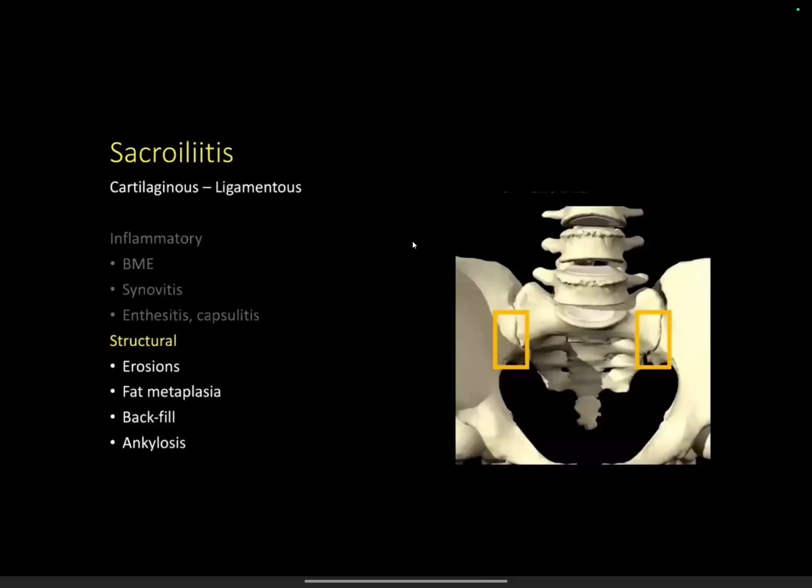In our practice, and there are a lot of papers also which suggest, you see the sclerosis on the sacral side as well, along with edema on the sacral side as well. So edema is not something which rules out osteitis condensans ilii. You need to see the typical sclerosis along with edema. Then that's a clue that this is osteitis condensans ilii rather than sacroiliitis.